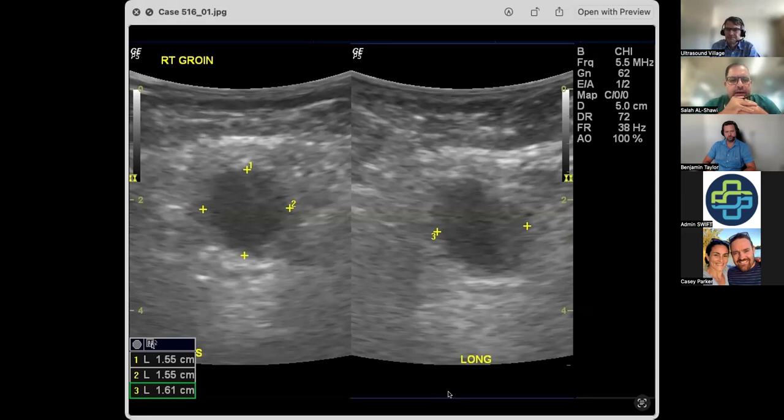It's a bit hard without having color to evaluate whether this is a vascular structure or not. The first thing I can see there is the measurements taking almost to the lumen, but there is a little bit of increased echogenicity around it, which is almost like whether there is a mural thrombus within the vessel.